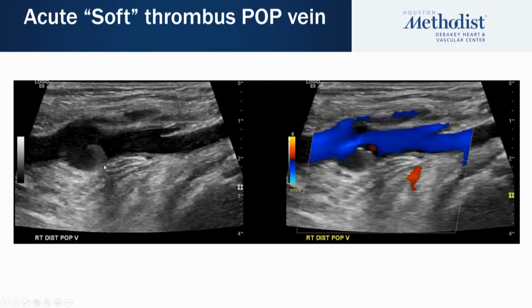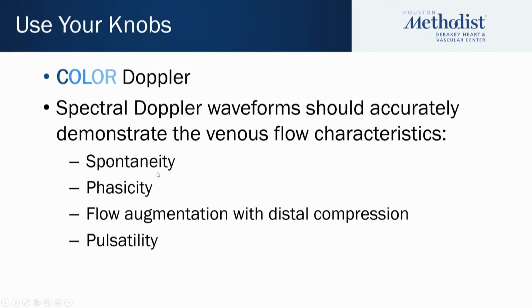This is an interesting example. What we see here is a vein completely patent, and here is the valve in the popliteal vein, and you see just a small amount of thrombus right behind the valve leaflet. On the active images, this was almost like a very thickened viscous flow. You could see this kind of swirl around, okay? So this certainly is a setup for deep vein thrombosis.